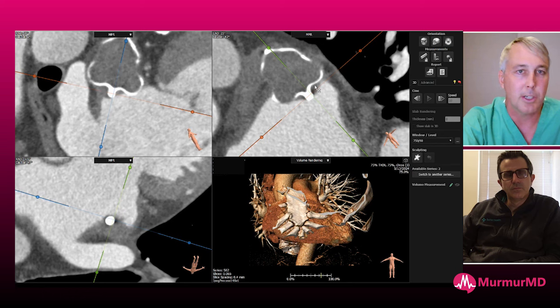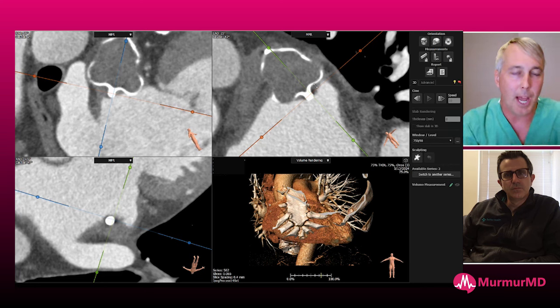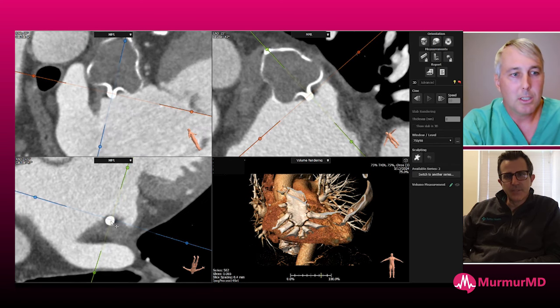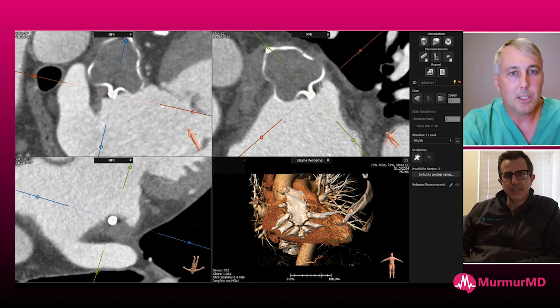And then also, you may have seen this in a case, after a device is implanted, when there's a lot of compression or sometimes when there's a leak, the fabric on the device kind of oscillates. Have you seen that during a case? Yeah, definitely. For me, it raises concern with over compression and kind of pleating of the fabric a little bit. But yeah, definitely the oscillation, particularly in someone in sinus who has a pretty vigorous atrial kick.